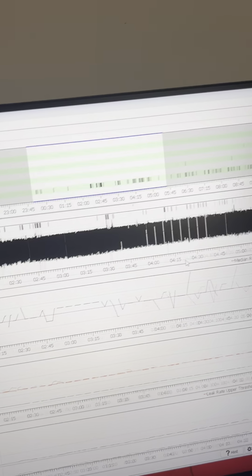Right here also I wanted to say that when you have leaks, you can't really see it right here, but maybe I have a night where I have a lot of leaks, just sudden leaks right here. So you see right here how there's a lot of under ventilation happening. That's probably because all of the CO2 leaked out here. You see?